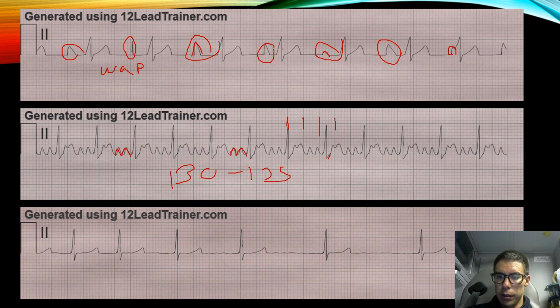Looks like one lost in the T there, maybe another one there. So I would call this a flutter with 4-to-1 conduction, which I'm not going to write all that out because that would take too long. I even just made an H instead of writing 2 T's. A flutter, 4-to-1.